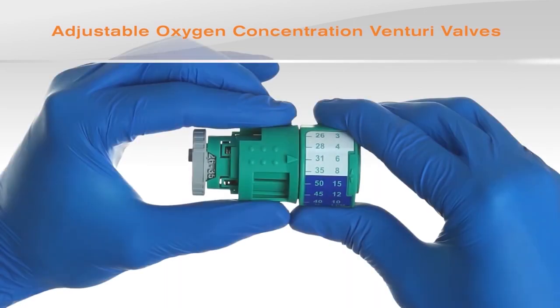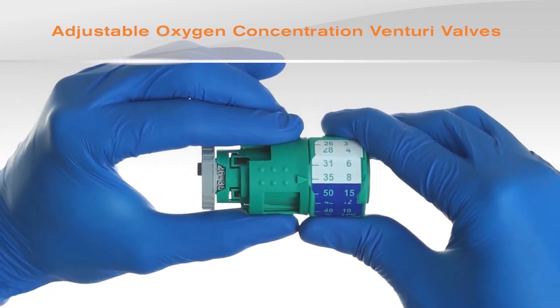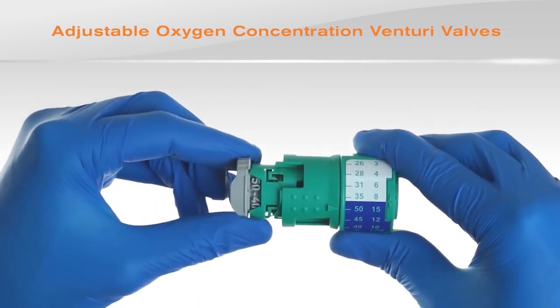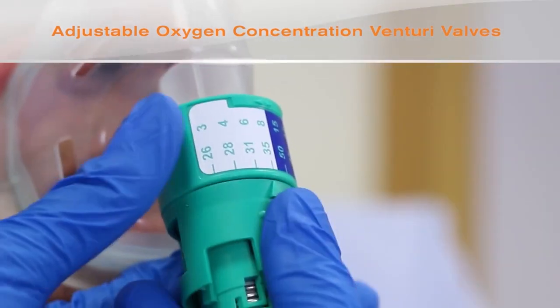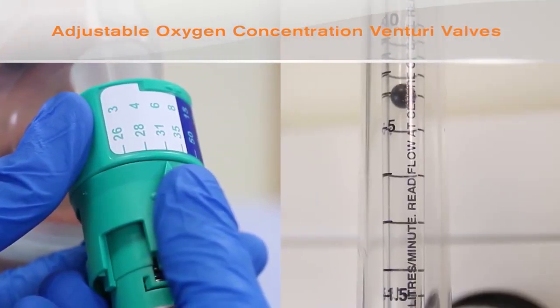If the desired concentration is between 40 and 50%, rotate the oxygen concentration selector to 35% and then pull and rotate the oxygen range selector to select the 40 to 50 range. Select the desired oxygen setting by rotating the oxygen concentration selector. Set the oxygen flow meter to the flow indicated adjacent to the oxygen concentration.